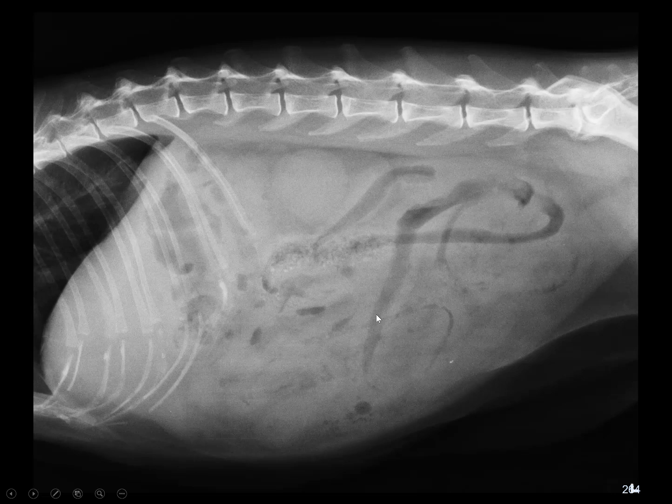As I just said, some of that could be fluid, so I don't know that all that opacity is truly wall, but there is some irregularity of the margins of the gas as it contacts that soft tissue opacity. So I do have to be concerned that this is truly gas against wall, and if all of that soft tissue opacity is wall, then it is actually thick.